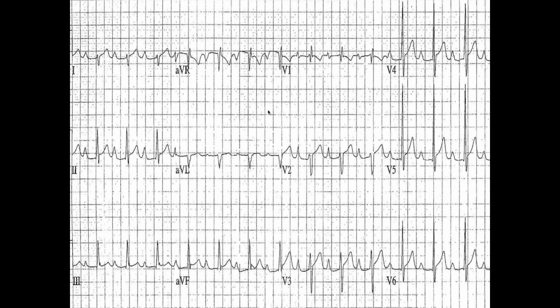Next step, do I have a bundle branch block? This is a little washed out here, but I think those QRS complexes are just a little bit wide, so we're going to go along with that for the sake of argument. Looking at V1, J point going backwards goes up. We're thinking right bundle branch block. To confirm that, we look at lead 1 and V6, looking for slurred S waves, and I do have those. So I have a right bundle branch block, and I have a left posterior hemiblock, so we're going to document that as a bifascicular block because I've got both of those going on.